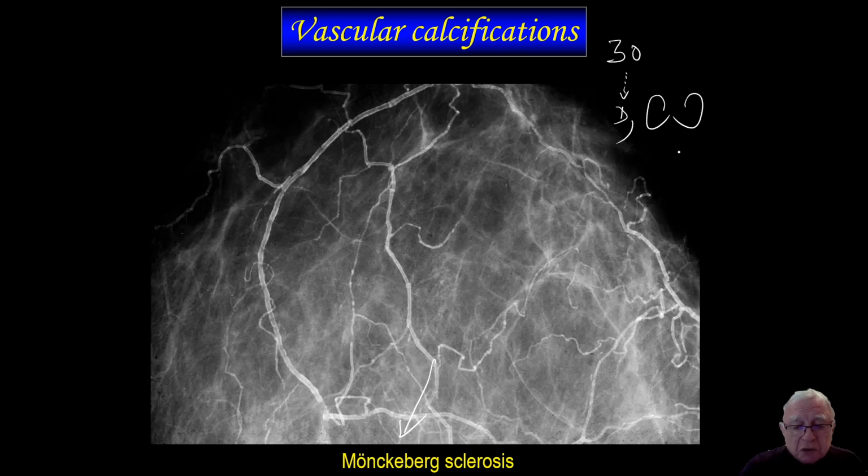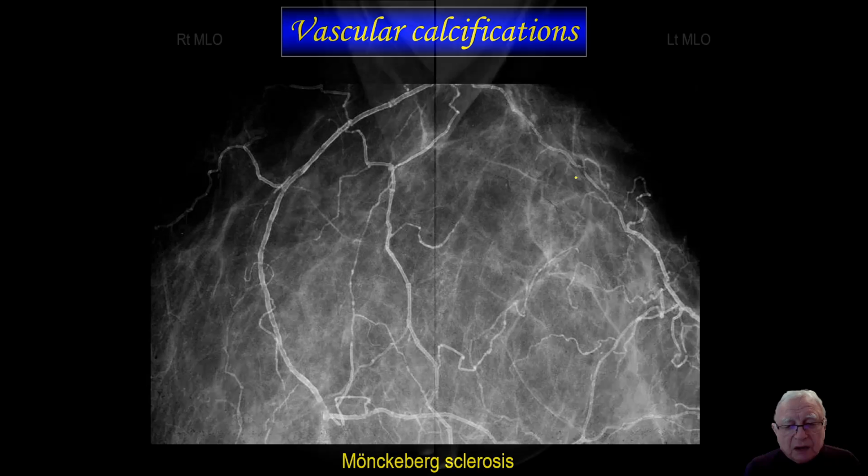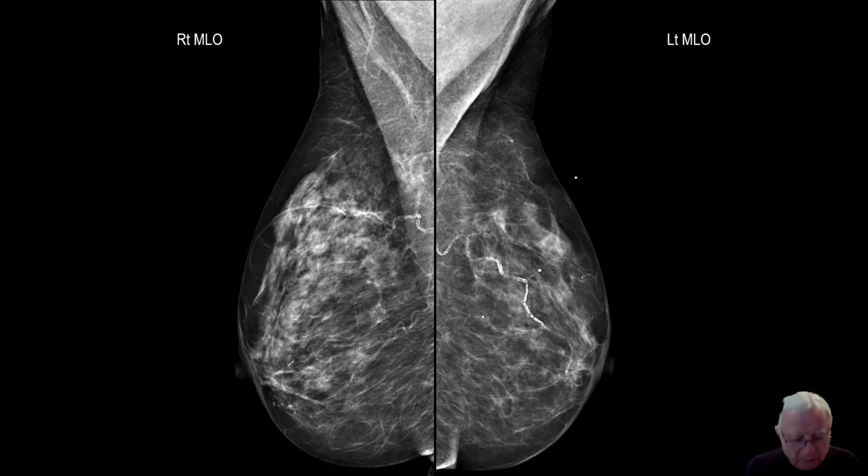Those radiologists who are working at hospitals, there are a large number of patients with kidney transplant, then you are going to see this kind of calcifications because it's the result of tertiary hyperparathyroidism. You just ask the question and you get a good answer. But now comes a topic I'd like to call your attention about. I'm not sure you thought about it. What do you see here?